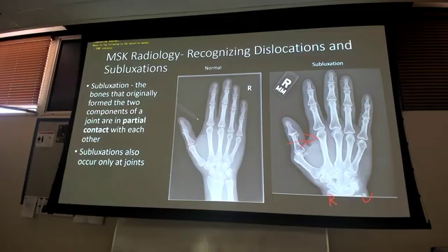If we got there, yes, we would use dorsal and ventral if I had that image, but I don't on here, so I didn't want to confuse anybody yet. I saw a couple of hands. Go for it, ma'am. Yeah, so when naming subluxation, what I would do on this one is, that's the proximal phalanx, so I would say it's an ulnar subluxation of the first proximal phalanx. So I would name the bone.